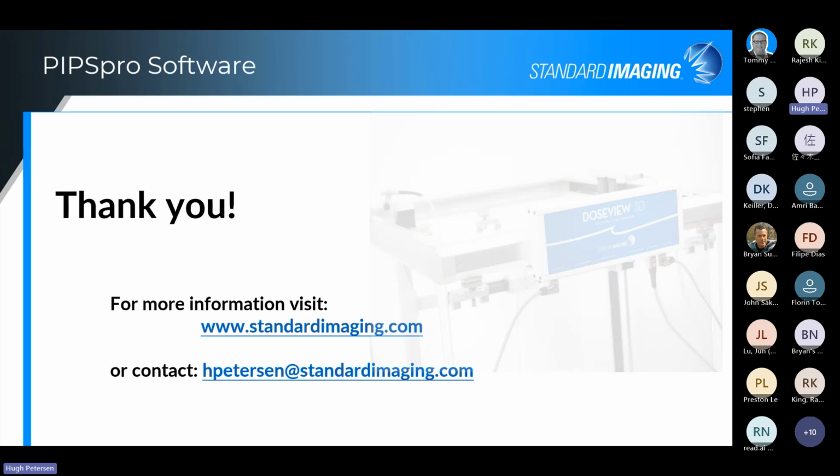So you always want to check back and utilize that same setting, because you use that for baselining, and that way we have consistent results as you step through. And if there are any changes in the image quality or the test quality of not only the CT sim check Phantom, but also within the LINAC components of the PIPSpro software, you always want to use the same parameters to be able to check back to that baseline, because we are checking back against the baseline.